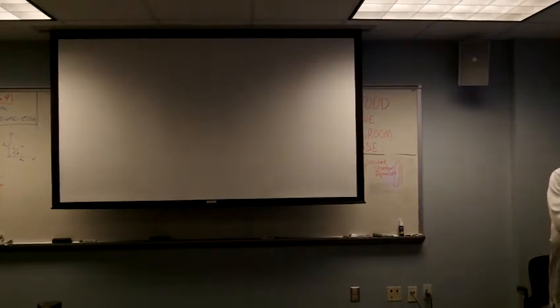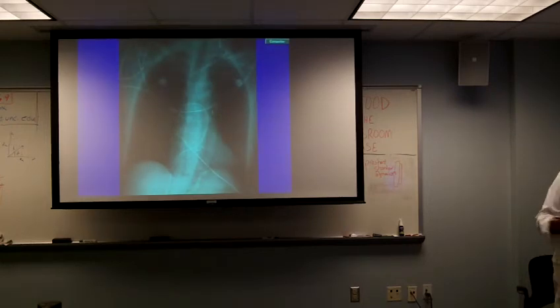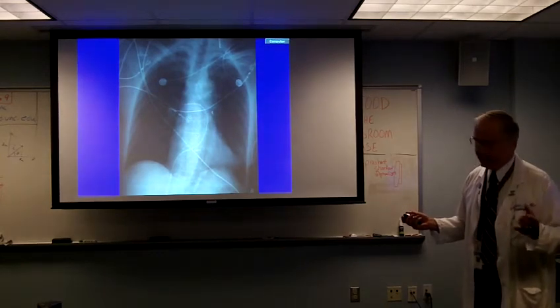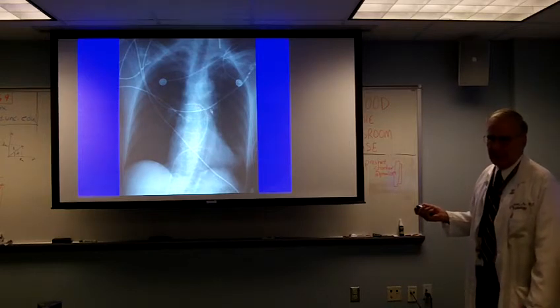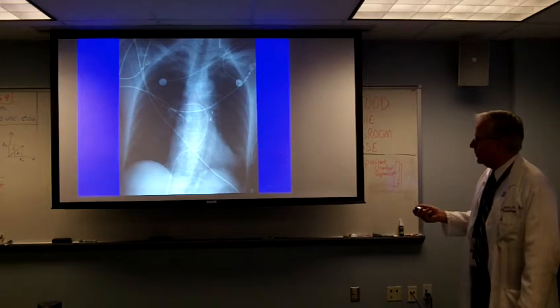It took a second for us to get back in sync with the machine, but suffice it to say, from this little radiopaque marker, if you've had somebody who's had coronary artery bypass surgery, and they've got sternal sutures through here and lots of hemoclips, that can get lost. And you don't recognize that, in fact, there is an intra-aortic balloon pump.